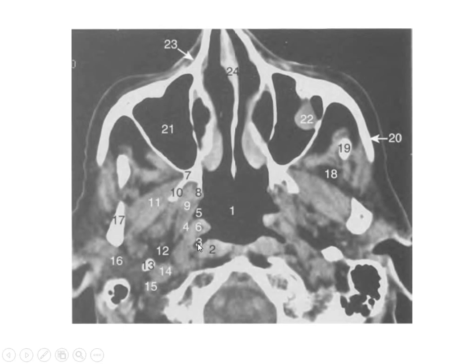That's why the most common location of nasopharyngeal carcinoma is the fossa of Rosenmuller, and when it extends to the adjacent parapharyngeal space, you should make use of the fact that it should contain only fat. When it contains anything other than fat, there is something suspicious.